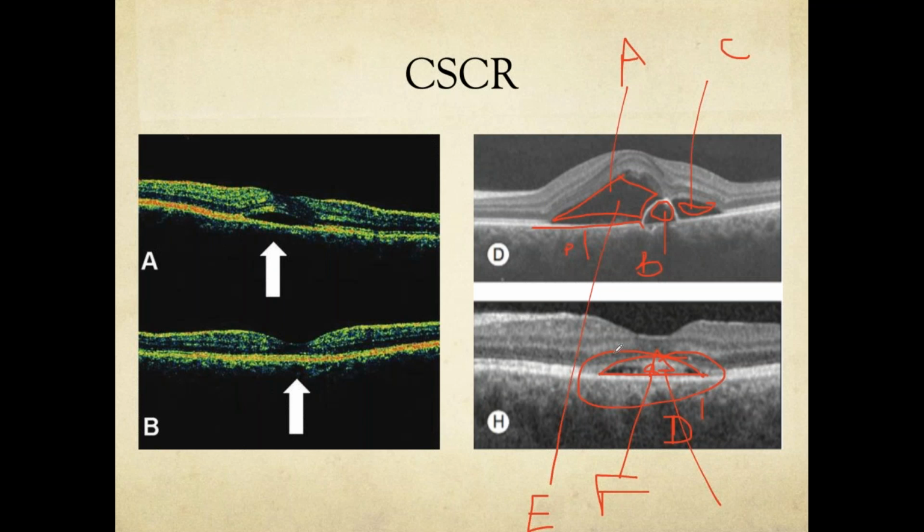Do you understand? So this could be either, if this is how you correlate, because if you see this occurring in both eyes and there's a history of similar findings in the family, and vision in both eyes is quite the same, then this could be a dystrophy. But if it's only in one eye, and the patient gives you a history of trauma, then this could be a subretinal hemorrhage.